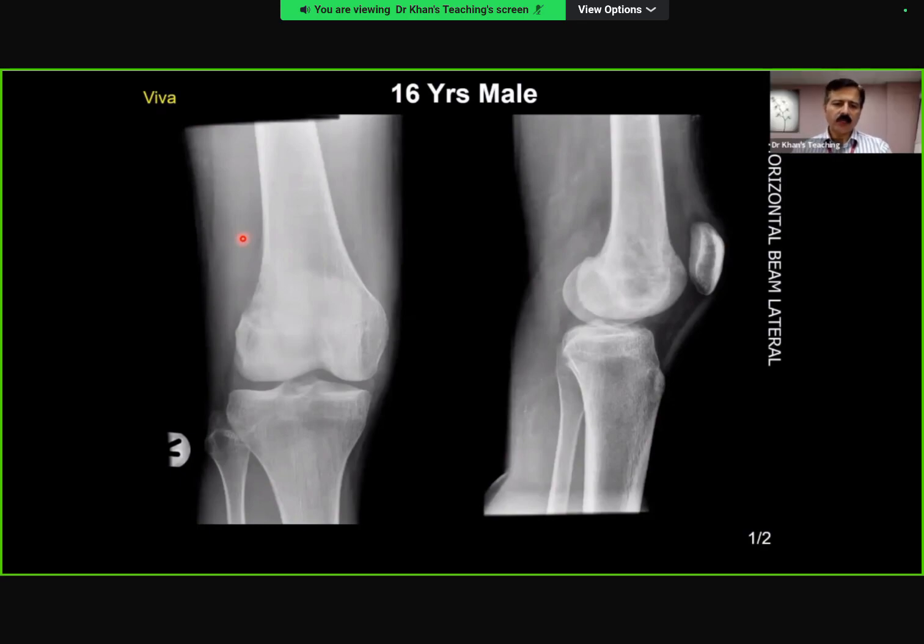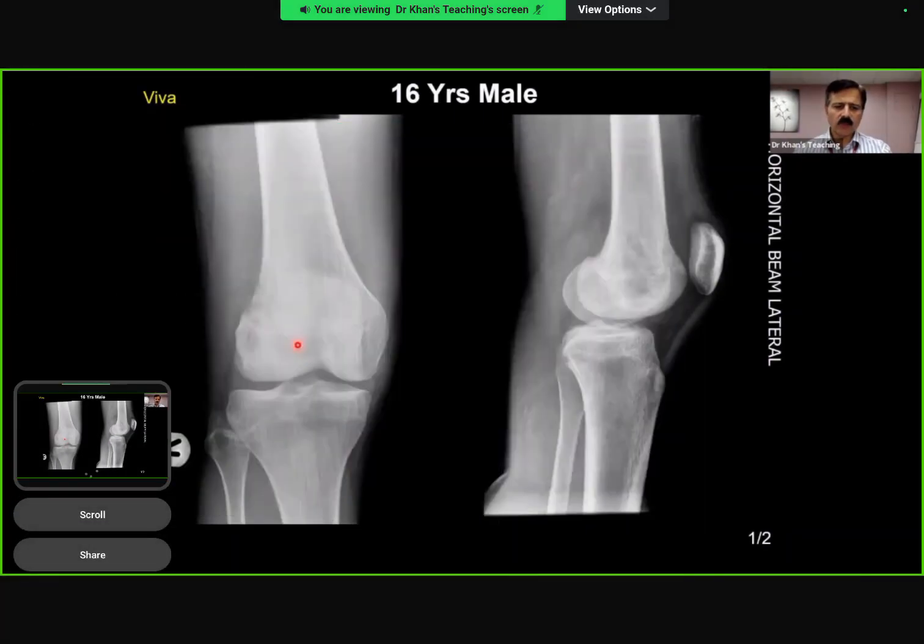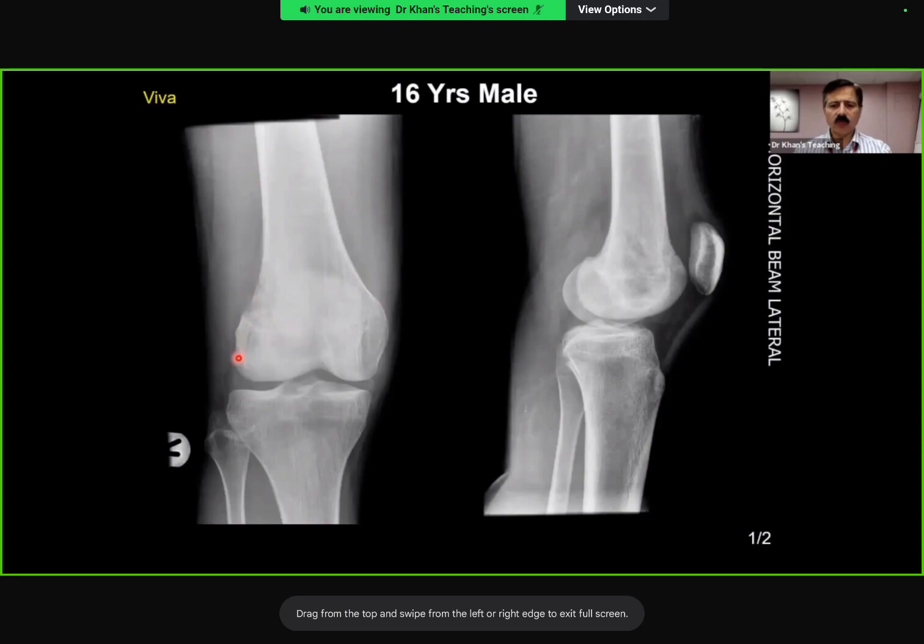Osteosarcoma. If you look carefully, this is a beautiful case because these kinds of cases are shown in the exam where the findings are subtle. Look at these trabeculae and you can understand that there is a bit of destruction. Though of course, when you see it in your Viva, the resolution will be better than this. And then you can see this subtle, look at this cortex and you will appreciate that this is a bit of erosion, there is a bit of permeative as you picked up. So if you stretch your imagination, maybe here where I'm pointing out, maybe a bit of osseous matrix is there, but it's a subtle finding. Overall, your differential is fine.